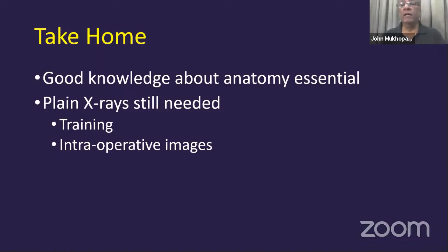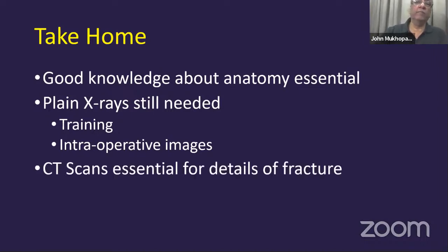Partly for training, I think your diagnosis of these fractures, and we'll be going through that next week, and how you diagnose the fractures and how you look at different views of the X-rays to tell you which part of the column or wall are involved. And also, as was mentioned earlier, most of us in the OT only have C-arm images to look at. So the CT is difficult to reproduce or recreate the anatomy based on the CT unless you also have an idea of the X-ray picture.